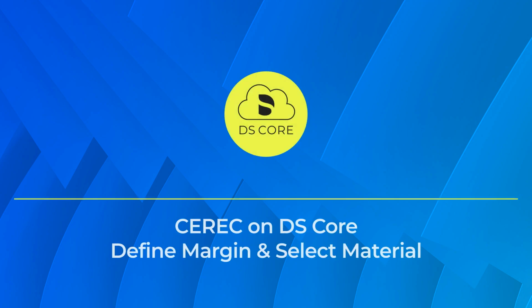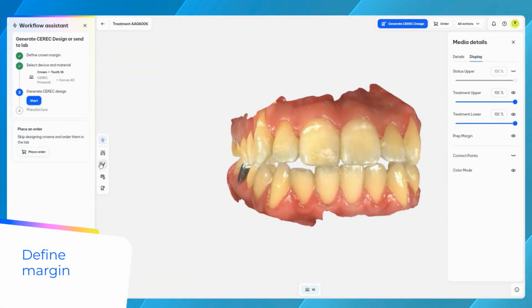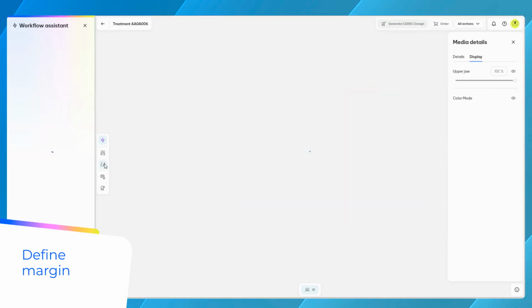The following tutorial describes how to create a margin and select material and manufacturing devices in CEREC on DS Core. Let's begin. Let's plan the crown. Every crown requires a margin around the prepped area.